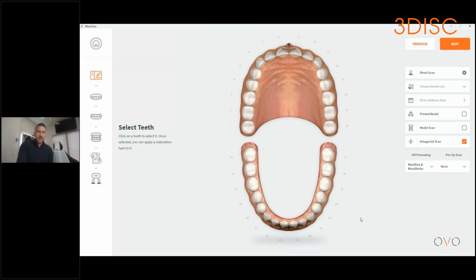It's just like using a stent to make a provisional crown. Once the stent is used to make that crown, it's not really of any actual value and usually is discarded after the procedure. So this data is not necessarily discarded, but it's not holding a ton of value unless you need to send it to a lab for some other purpose. But for Alphabyte and prefabricated crowns, it's more or less useful in real time.